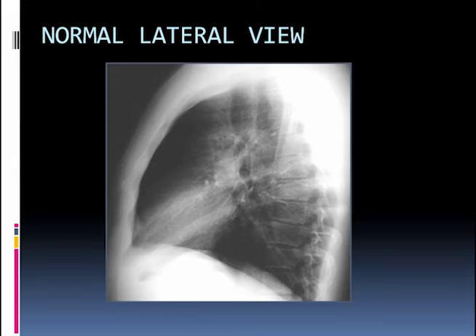On the other hand, the left pulmonary artery, as I've told you, goes up and over the left mainstem bronchus. And here you can see it as a white area that goes over to the back of the bronchus. And the bronchus is a big black hole that we see in the middle there. That's the left upper lobe bronchus, right on.